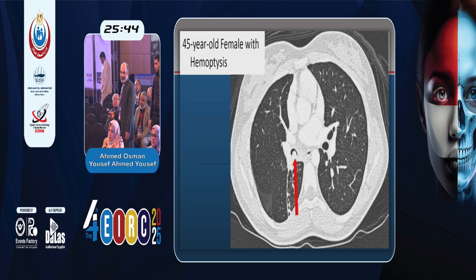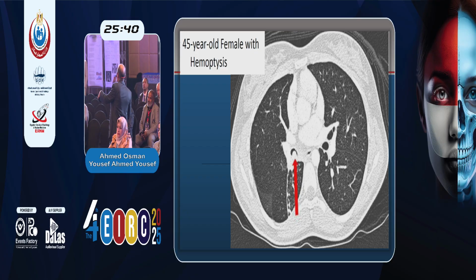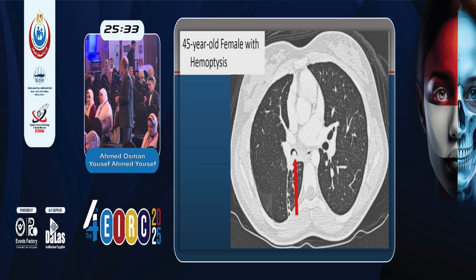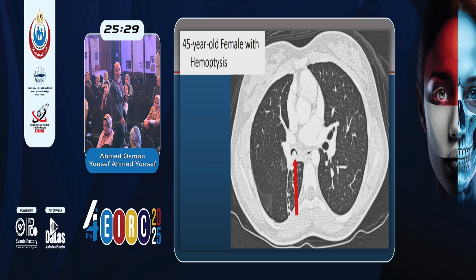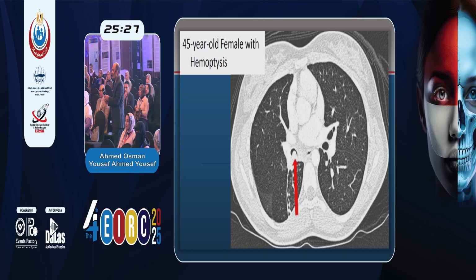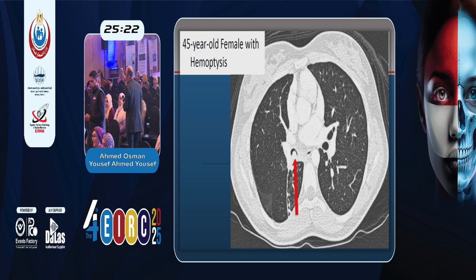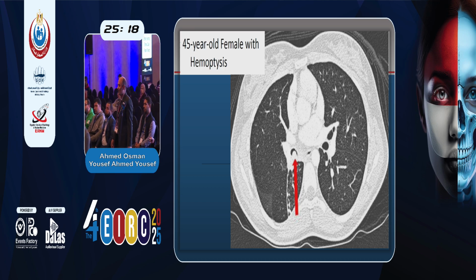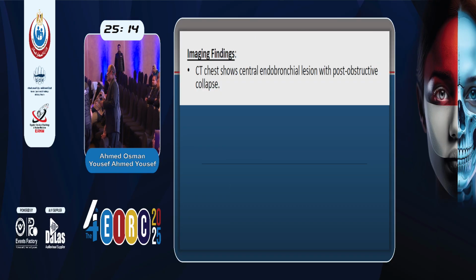Other differential? This is a well-defined, rounded, enhancing lesion. Who wants to share? Yes, we have an answer here. Who said carcinoid? Yes. Carcinoid tumor. Yes, yes, yes.